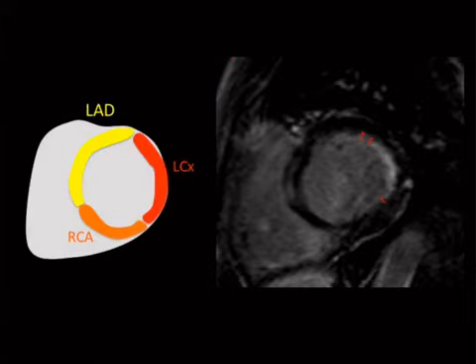All right, so let's take a look at one. So here we go. This is an inversion, right? We've nulled the myocardium, and it is what they call an LGE, or late gadolinium enhancement. And right here, we're seeing enhancing scar, and it's in a subendocardial distribution. In other words, it's the first thing you come to here, this part, subendocardial. And we mentioned that it was in a vascular distribution.